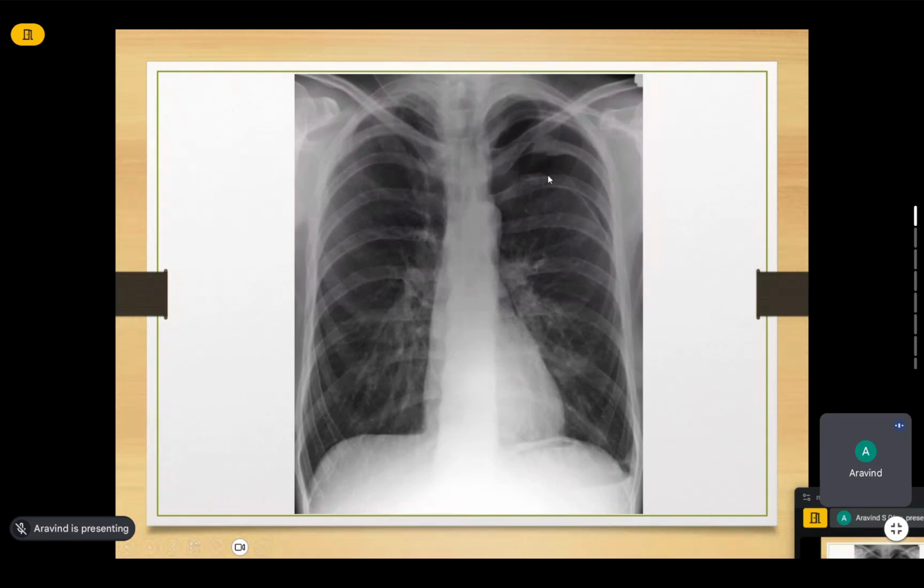It is very blackish. These are lung field markings. These branch-like things are the markings of the vasculature. Whereas in this zone, the upper zone of the left lung, you can see that there are no lung field markings. It is very blackish. You can also see a border-like thing here, a line-like thing. Actually, this is the visceral pleura. The patient is having pneumothorax, presence of air in the pleural space. The visceral pleura has been pushed down. So the lung is compressed slightly, and here we don't have lung. Here there is only air because of the rib fracture.